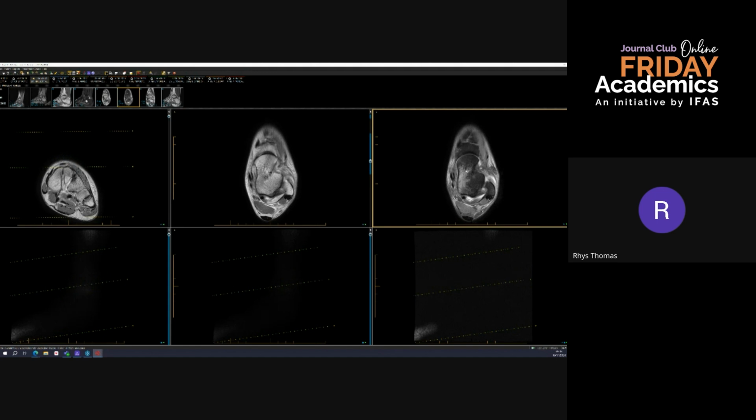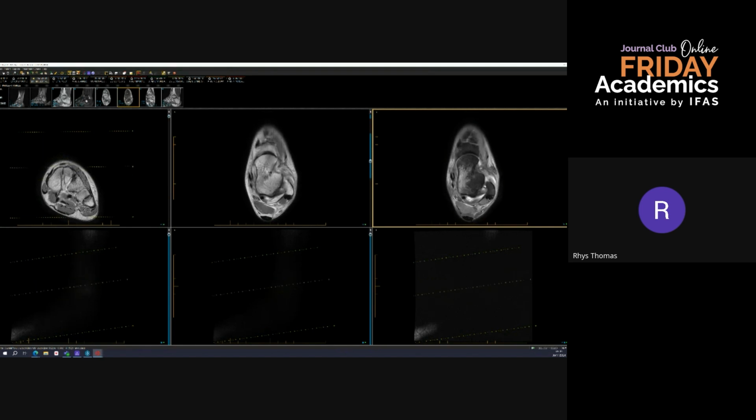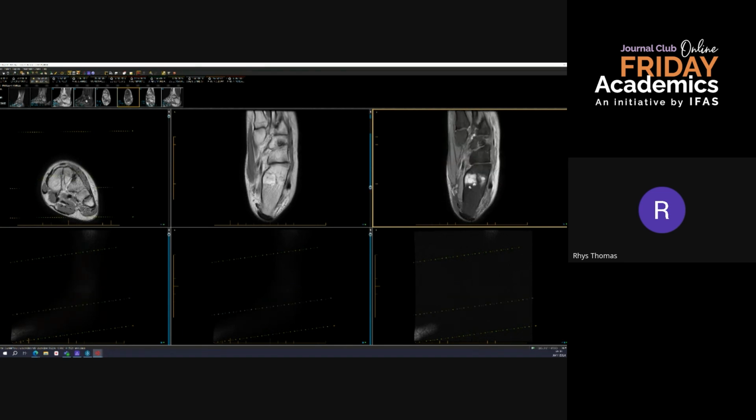So we have a high-grade tear here. And then we're also seeing a lot of bone marrow edema in the talus, and we can still see the striations within the deltoid, but this hyperintense, there's been a contusion to the deltoid ligament there. Again, you can sometimes cast an eye on the CFL here, and I get the impression it's thickened there, but I'll confirm that shortly.